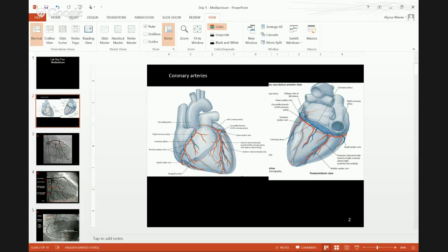Here we're still seeing left atrium. We're starting to see more of the muscular left ventricle. Okay, we're seeing the arch of the aorta, all that good stuff. Moving more forward, these ones I think are a little bit easier. We're going to do 2 moving forward, and then 3 moving forward.